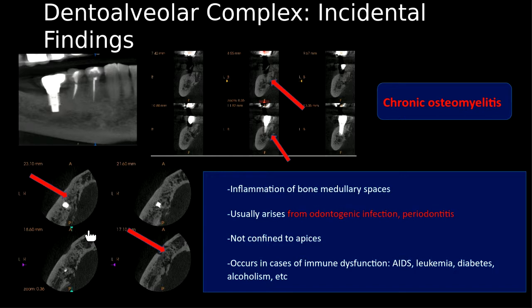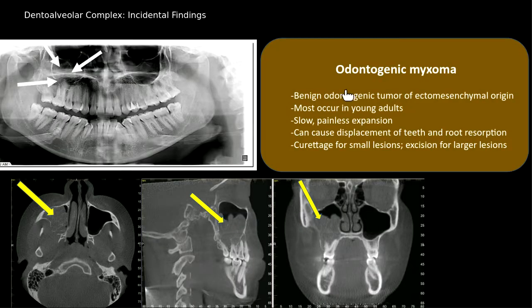Over time, when I saw the mandible, I asked the patient, is your mandible kind of moving in two segments? He said, yeah, a couple of days back I felt that my mandible is kind of shaking. I feel like there are two different segments. I said, this is a pathological fracture for you. Now the patient is undergoing treatment. Oral antibiotics don't work anymore, so they're using IV antibiotics, and the patient is now admitted in St. John's Hospital.